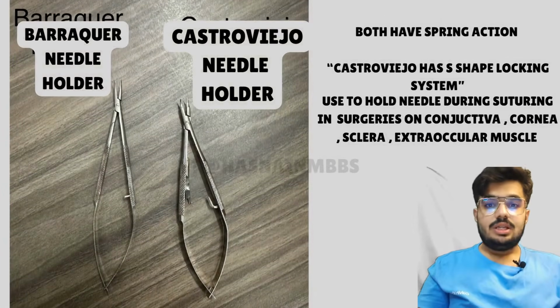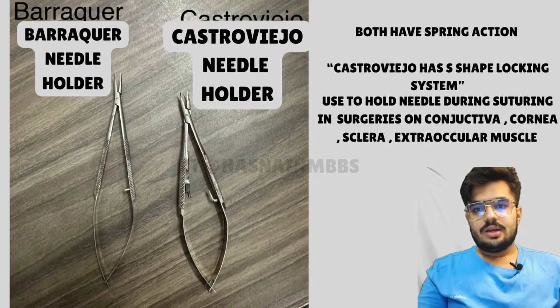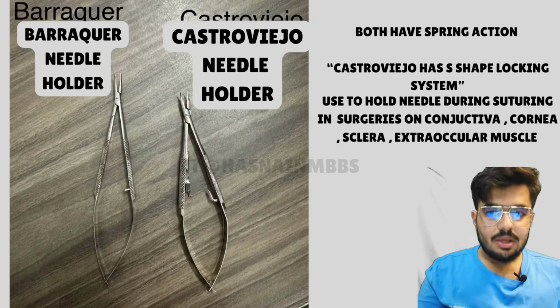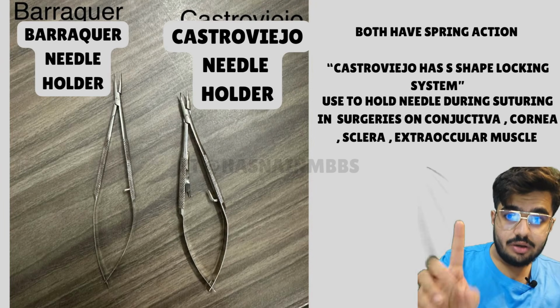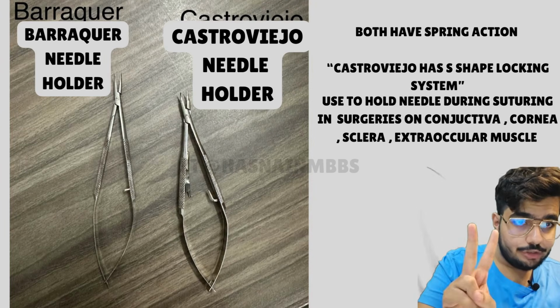Now I'll talk about the needle holder. Needle holders are used to hold the needle during suturing. We have majorly three types of needle holder. I am mentioning two over here: one is Barraquer and the other is Castroviejo.